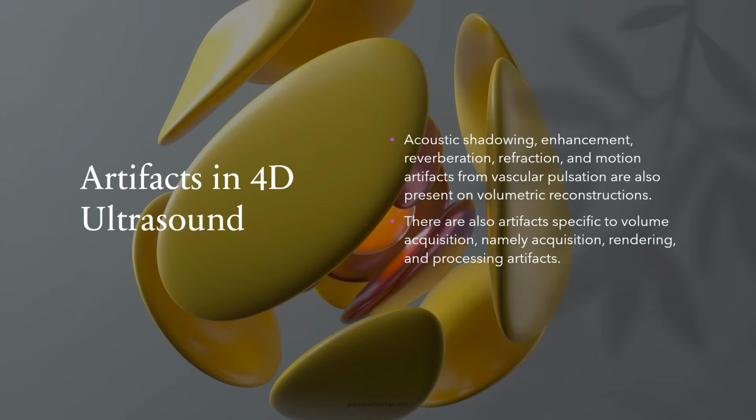To reduce the impact of these artifacts, it's crucial to adjust ultrasound settings such as depth, focus position, gain, and frequency to optimize image quality. Additionally, during the rendering and processing stages, advanced software tools and techniques can be used to minimize distortions and artifacts, ensuring clearer, more accurate volumetric reconstructions.